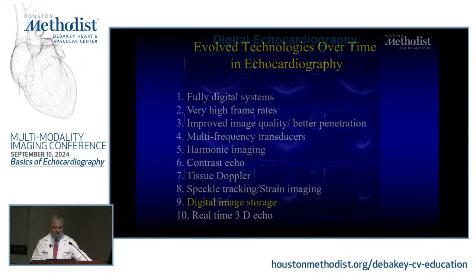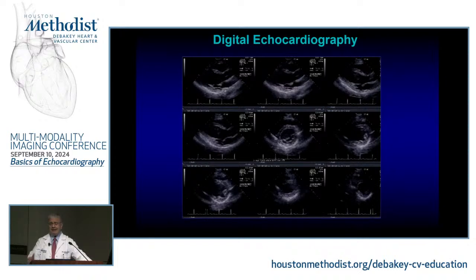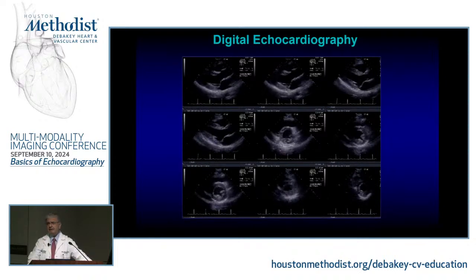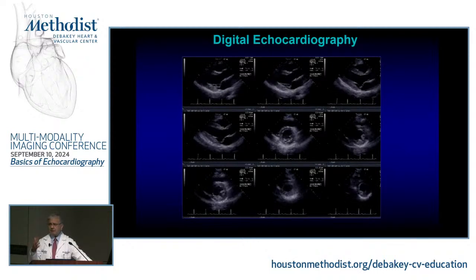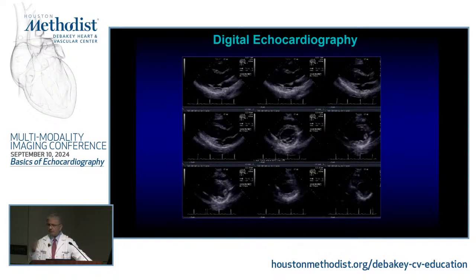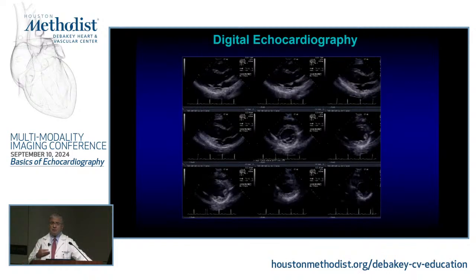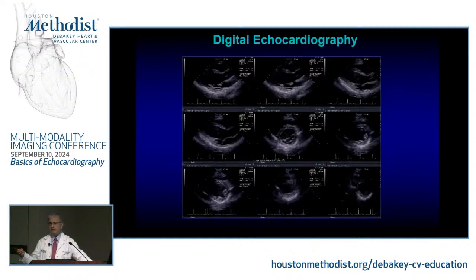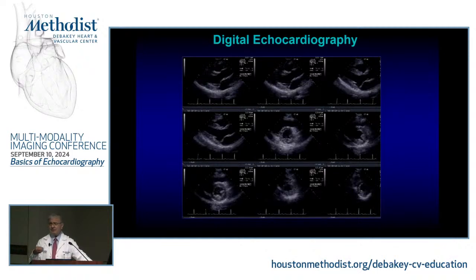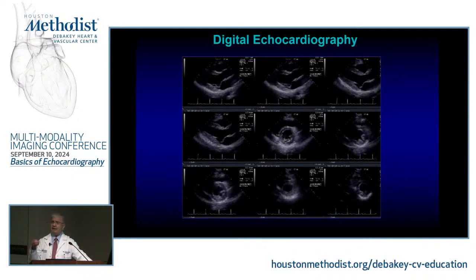Digital storage, why do I mention it? Because it's part of your routine. I like a 9-frame display. I can go through a heart first, get a feel of what this heart is about before you start quantitating and doing things. You could go through the whole heart within just a few clips. The other thing is, this is where it helps you know where to measure and not to measure. Remember, this is tomographic imaging the vast majority of the time, so you need to know which hearts are foreshortened, which ones are better, so it can help you choose by comparing the various views.